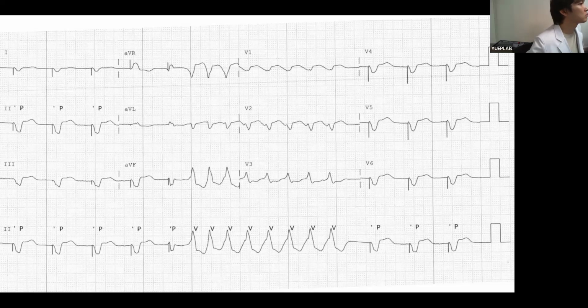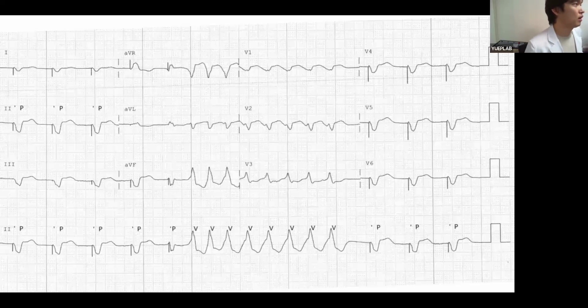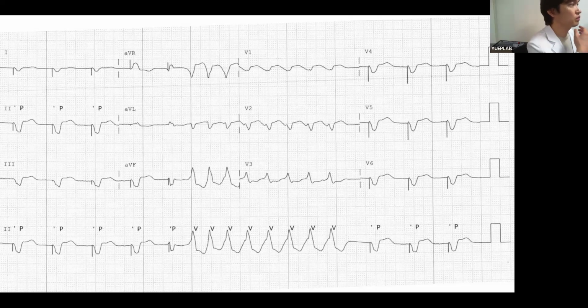Is it a standard 12 lead ECG or telemetry? Maybe not a standard EKG. It is a standard EKG. But how do you display all 6 leads? Is it Philips telemetry? Is it outside the patient's rhythm or inside the patient's rhythm? Maybe our telemetry doesn't show all the precordial leads, only V1 and V5. Yeah, right. So I was wondering how this patient got the whole EKG.